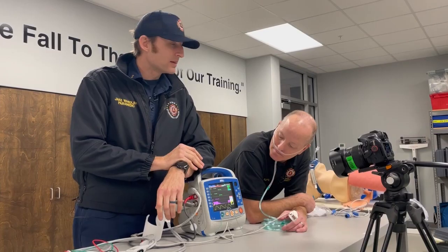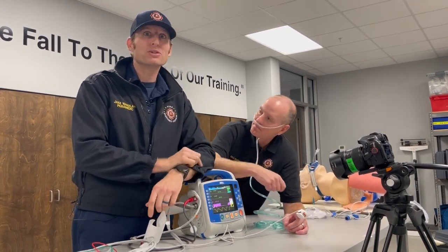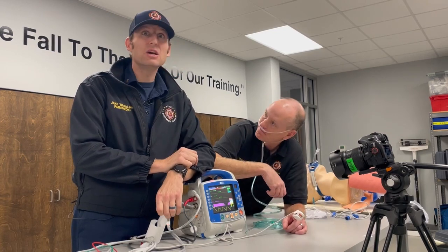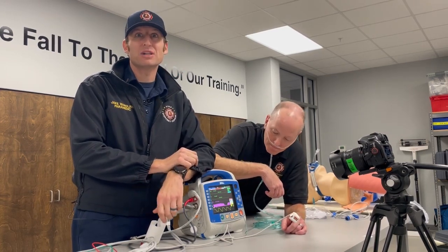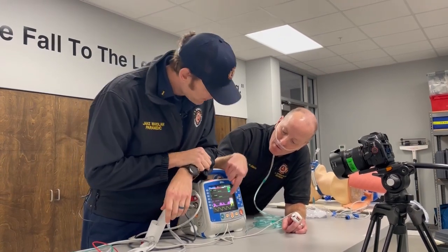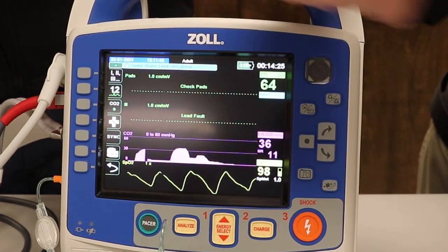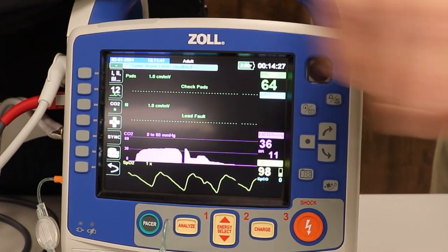You might have someone who is obviously in respiratory compromise because the mechanics aren't working well, and that pulse ox will hold. It'll stay still. I want you to see the side by side to see how quick that capnography is going to give you, hey, something's wrong. I'm going to watch this. I'm going to hold my breath. My pulse ox will still stay in the 98s, but watch this. This will dump immediately.